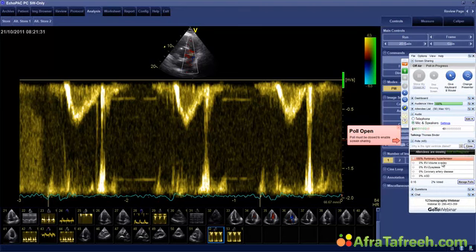But anyway, does the patient have some primary problem of the right ventricle, like right ventricular dysplasia, arrhythmogenic right ventricle? Or maybe he has coronary artery disease and it is a left heart problem, or maybe something else. And maybe the patient has an atrial septal defect, and this caused dilatation of the right ventricle and is his problem in reality.